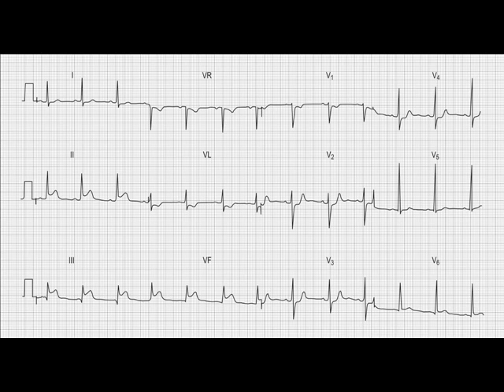That's not uncommon. And the other thing to point out is if you look at lead 3, you'll notice after the little P wave there, it drops down. You've got a Q wave before the tall R wave. This is not unusual in a myocardial infarction that has been allowed to progress for a number of hours. A Q wave is growing, and that will grow if untreated, and that will stay forever.